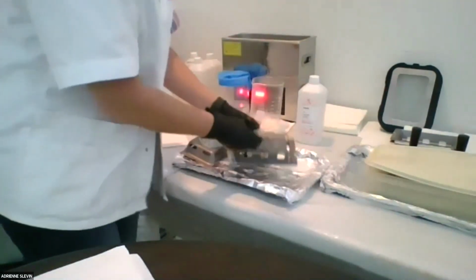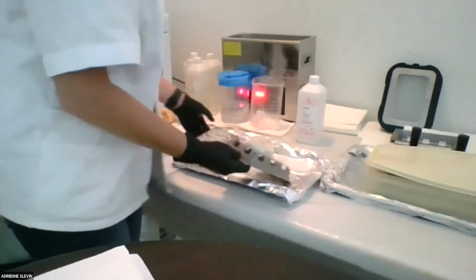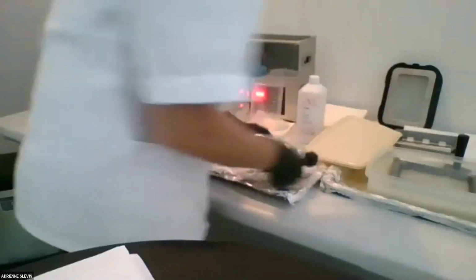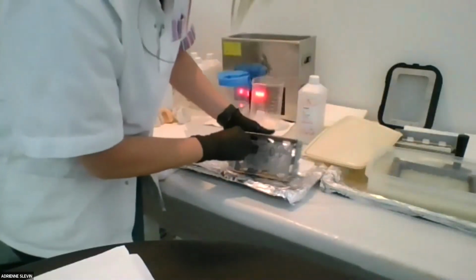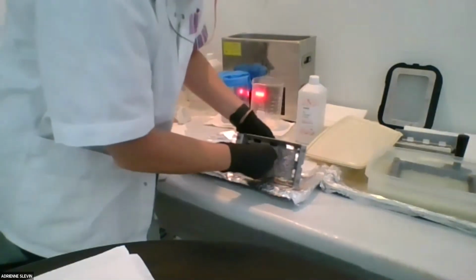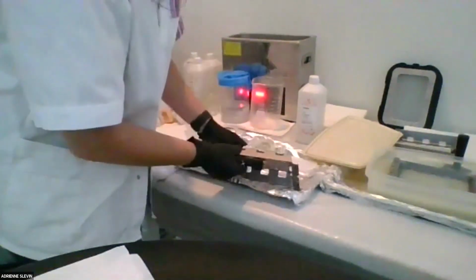Now, if you have something that's fragile, you can always use your punch tool and punch it out as well, okay? So hey, what I do is, real quick here for the audience, somebody was asking, you mentioned a minimum of 91%, but what if you use a higher concentration, 95 or 99%? So what you'll want to do is just add a little bit of water in there. Depending on what it is, offset it with that water, so then you don't have that white residue.